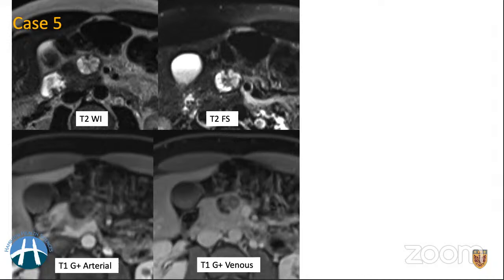So this female came here for an outside referral because an MRI of the abdomen was performed to evaluate an incidentally detected pancreatic mass on ultrasound examination. As you can see, I have tried to label the images and just select the key images here.